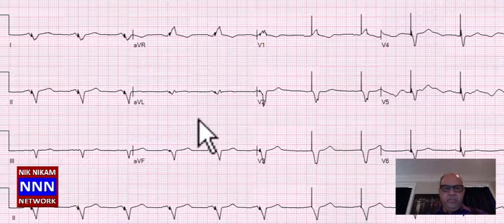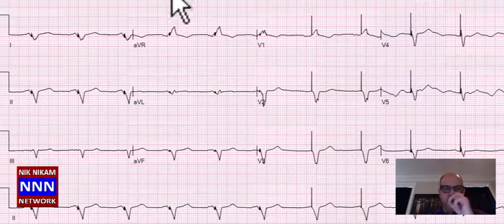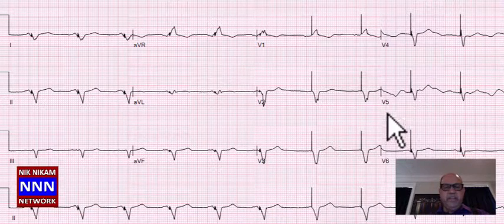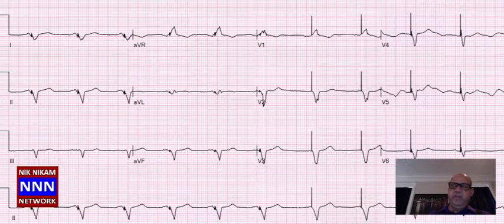Next, this is a pacemaker rhythm. See, how do you know this is pacemaker rhythm? Well, look at the spikes here. They are regular. The rate is about 60. When you see spikes with wide QRS complex in every lead, that's pacemaker rhythm. I mean, that's our first and final diagnosis. Beyond that, we can't interpret very much unless we see some other underlying rhythm which may give us some clue as to what is happening with this patient.